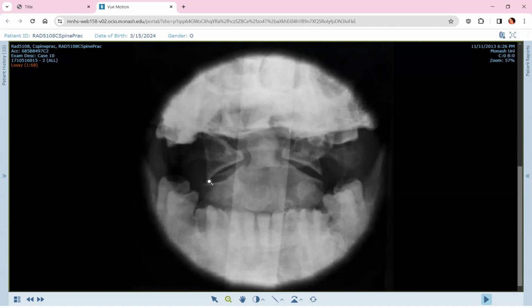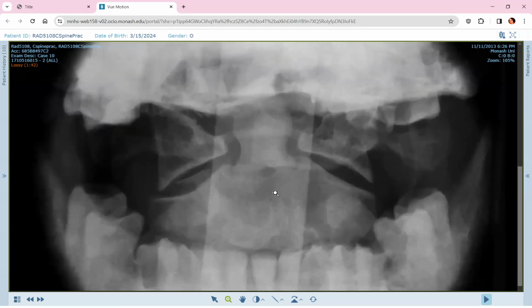When we look at our lateral masses, they are fairly aligned with each other. The distances are okay. However, when we look at the base of the odontoid, so this is not a Mach effect, there's a fracture at the base of the odontoid. So that is also an unstable fracture.